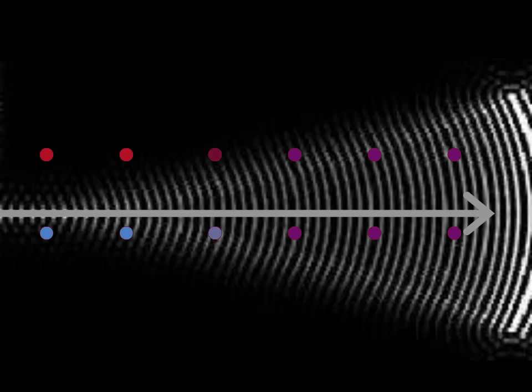Lateral resolution is generally poorer than axial resolution and is dependent on beam width. As the ultrasound machine assumes that any object visualized originates from the center of the beam, two objects side by side cannot be distinguished if they are separated by less than the beam width.